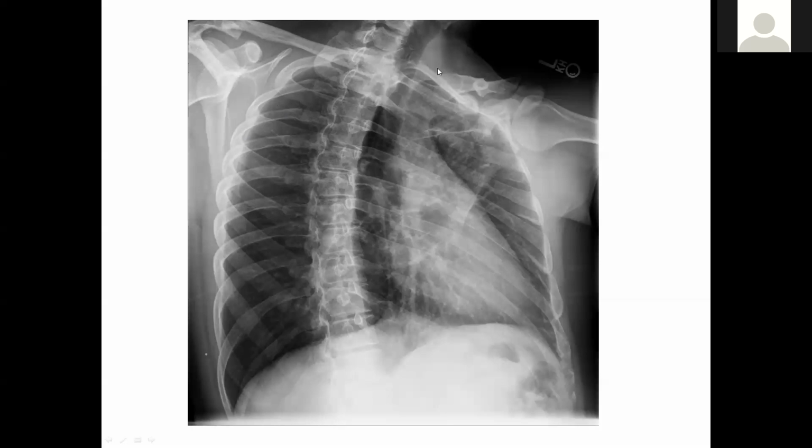Right clavicle, left clavicle, distorted up here, your acromion, scapula, and rib 12, hard to see, but down here. BB marker, so this patient is injured on this side.